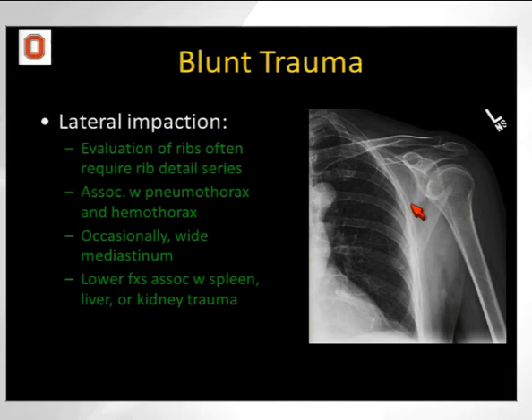Now note that this patient has a transverse fracture of the scapular neck. It requires tremendous force for a patient to sustain this kind of injury.